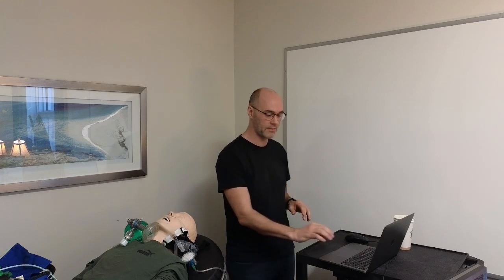So let's jump into talking about non-invasive mechanical ventilation. Non-invasive mechanical ventilation has changed greatly in my career. Since 20 years ago when I started in an ambulance, we have seen much more availability of CPAP pre-hospitally, and that has been a great benefit to patients by decreasing the need for additional advanced airways, with fewer intubations, which are better for the patient.